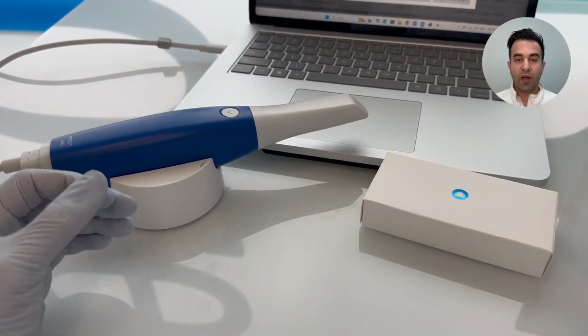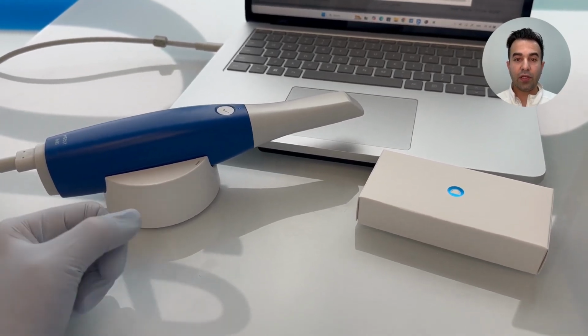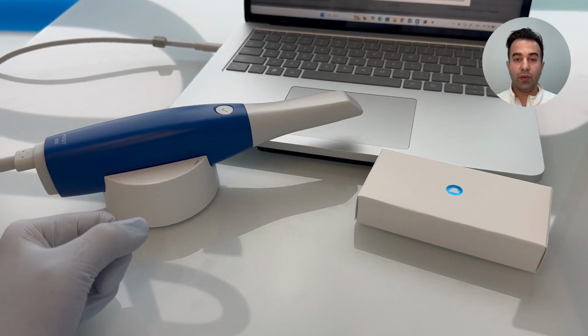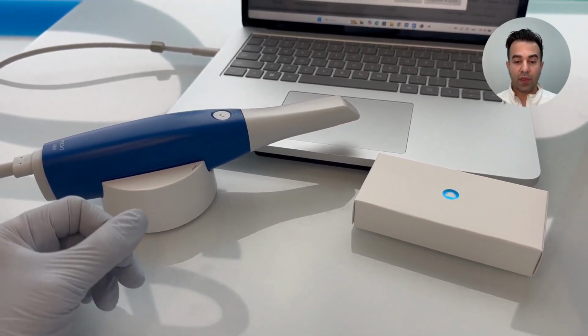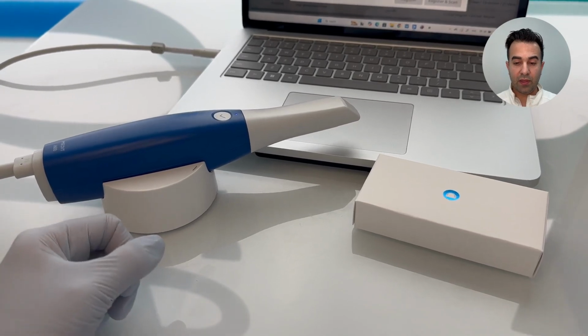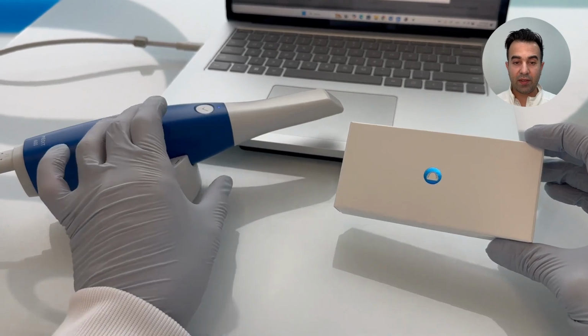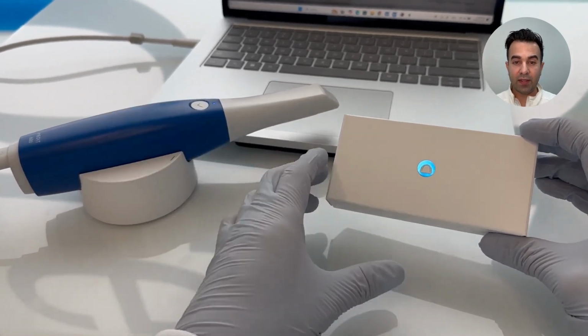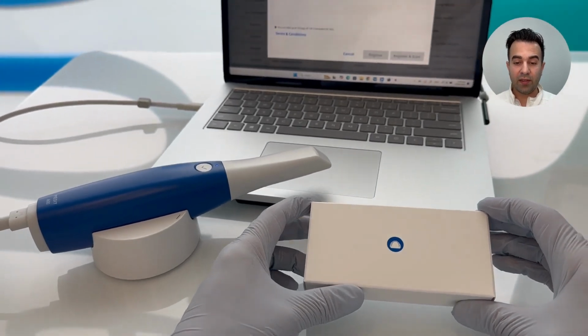All right, so I'll show you the steps that you can follow in order to obtain your own 3D teeth library. We are going to use the practice model that comes with your Medit scanner to obtain the 3D teeth library using the copy-paste technique.